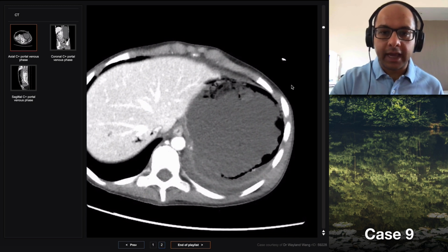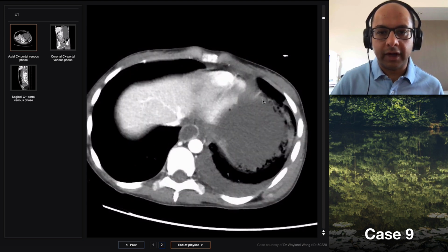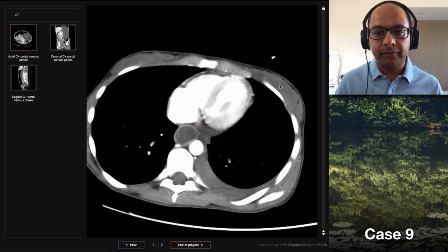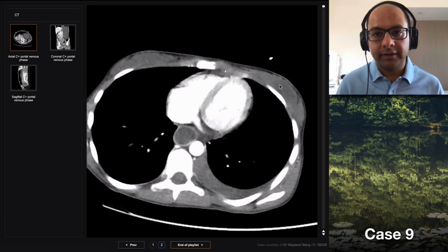So can you scroll? I've handed the control to you. Can you scroll? Yeah? Am I doing it? Yeah, you are. I can see that. Yeah, go on. Right, from the very top.